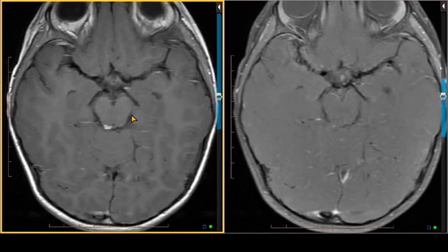A tectal plate lipoma will often show up at either the 5 o'clock or the 7 o'clock position, and that's exactly where we see it in this individual. So being aware of the normal location for this lipoma, as well as being aware of the MRI techniques you can use to confirm the fatty nature, fat-suppressed imaging, both pre and post-contrast in this case, allows you to confidently state that this is an incidental lipoma that does not require follow-up and should have no implications to the brain development.